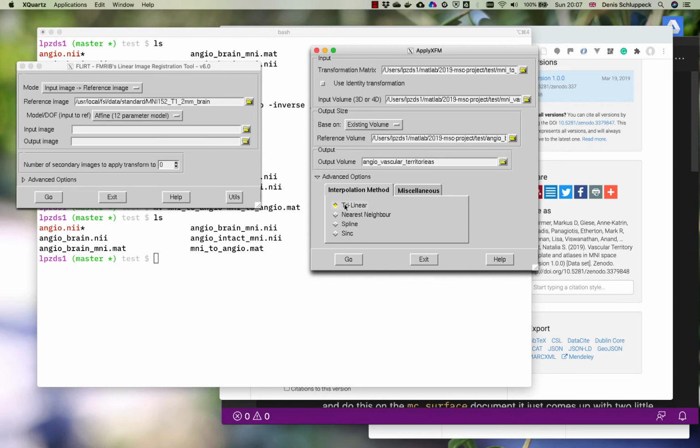So I need to control how the image is being transformed into this destination space. The choice here is nearest neighbor, because we want to guarantee that each voxel in the destination space can only ever get a value that was present in the original image. If you've got a question about that, that's something for the interactive session. Maybe ask me to go over that again if you want.